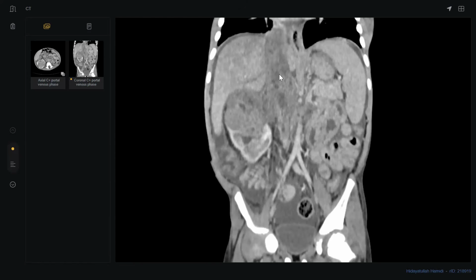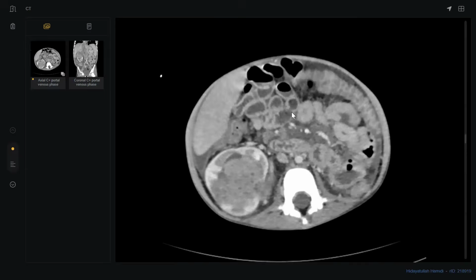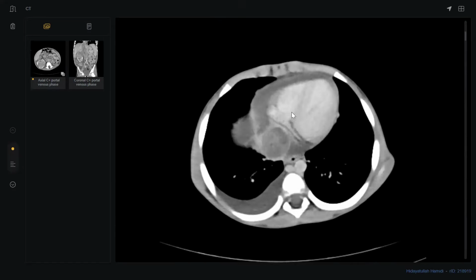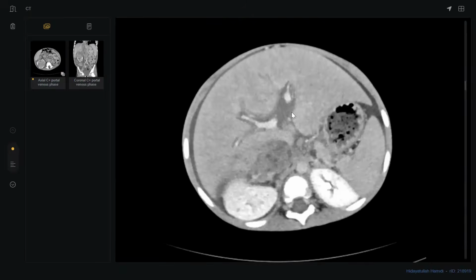The thrombus enhances exactly the same and is exactly heterogeneous like the original tumor, so it is 100% tumoral rather than plain thrombus. This patient, by the way, is inoperable. And this is the role of MRI: when it is discovered on CT, they shift to MRI to differentiate between tumor and plain thrombus.